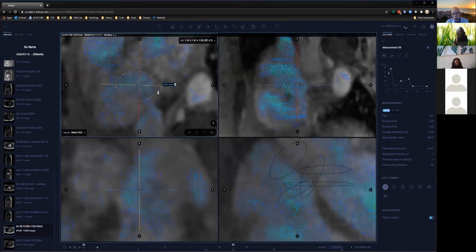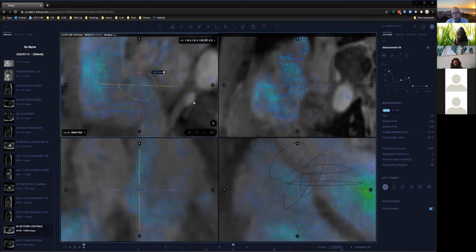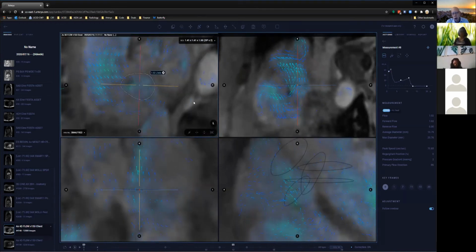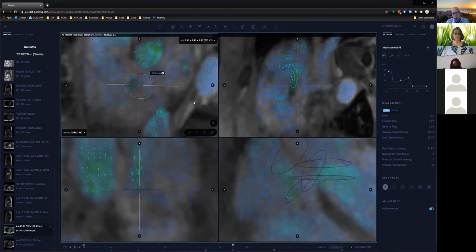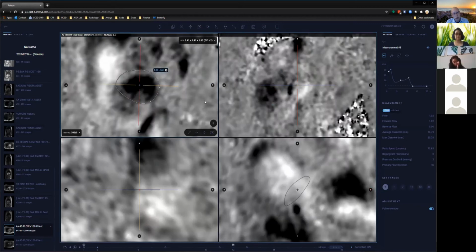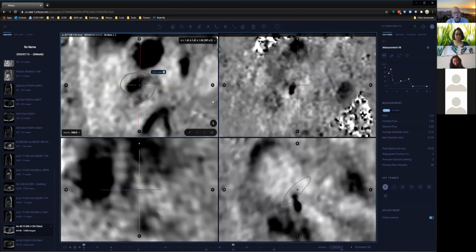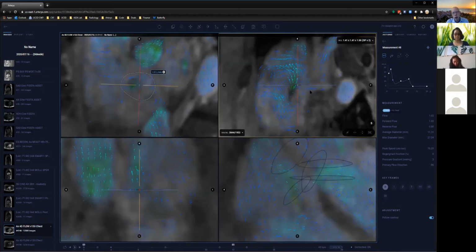If I don't like a phase, I can also delete it. And when I delete the entire segmentation, it'll revert it back to interpolating in between phases. So like I just did, I took off one of the segmentations and I can redo it pretty easily. So that's those two phases, and then we'll just quickly walk through this. Now my orientation is a little bit off.